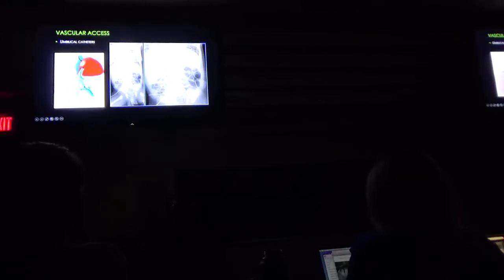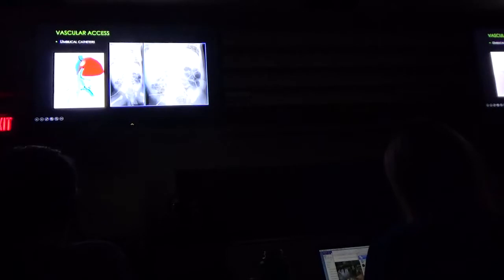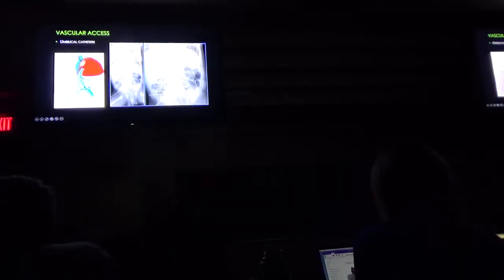Here's another one. It went down and never came back up, so that's bad placement. This one went up. Looks like it's probably going to end up in good placement. Don't let this be your final view. I think they just zoomed in to focus on this here. So you actually could see where it terminated up in here.